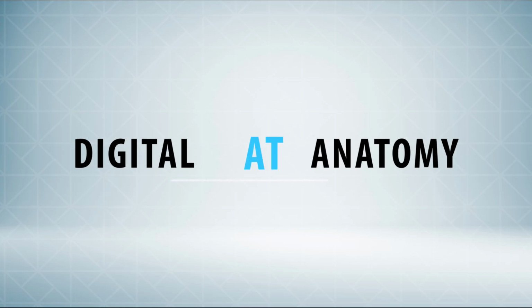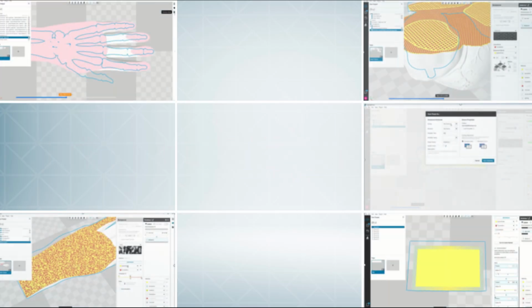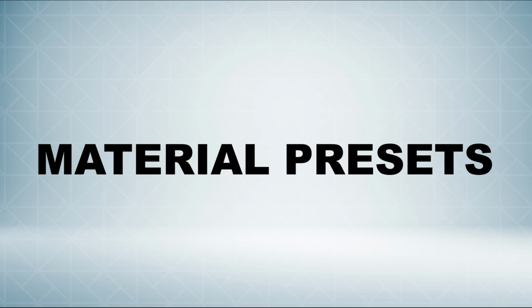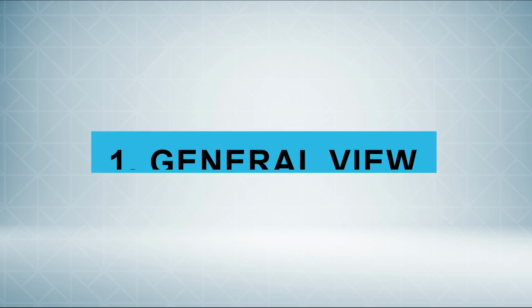Welcome to the Digital Anatomy Creator Software tutorial. In this series of videos, we will learn everything there is to know about DAC, its capabilities, how to create material presets, and how to print them. Let us begin by looking at the general view.